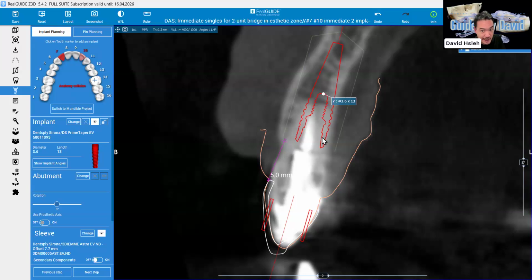We try our best to hit our 3-2 rule, but this is what we have, right? Sometimes, even though we know it's a 3-2 rule that we need to follow, sometimes we have to do 4, and here, maybe we're gonna go 5. So yeah, that's good.